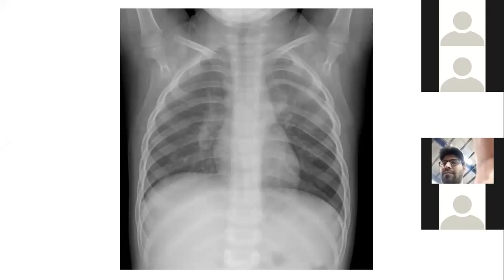Yeah, someone has commented the widening of superior mediastinum. Ribs are expanded. Thyroid mass. Okay. Rib interspace distance. Yes, exactly. So someone has identified that. Yeah. Can you see that there is some lesion here, right? It's unfused epiphysis. So it's a child. Okay. So it's a child and there is a lesion here in the left hemithorax.